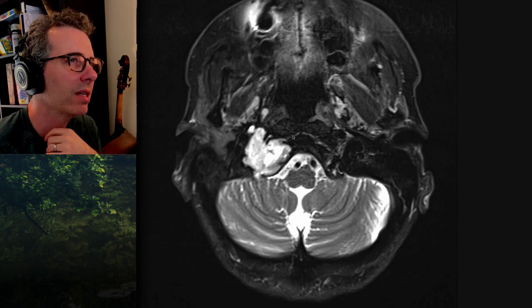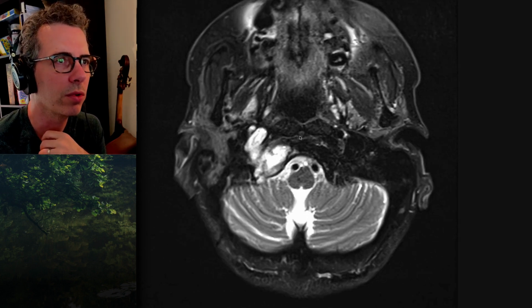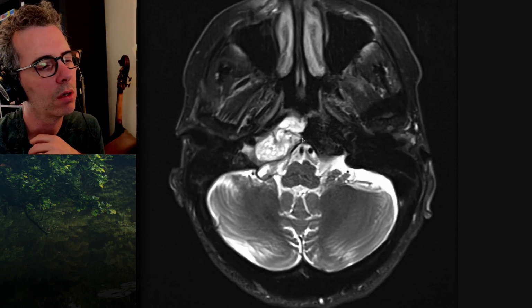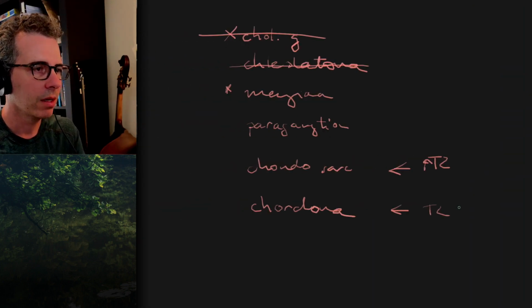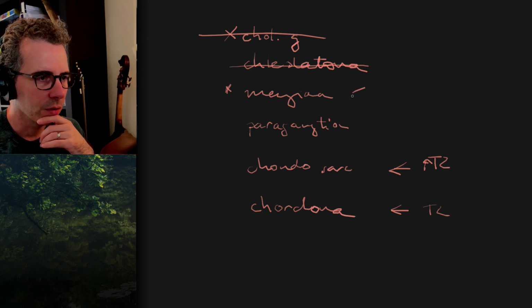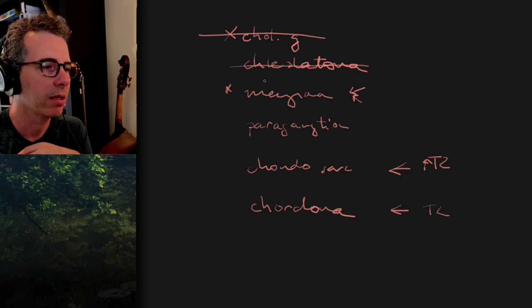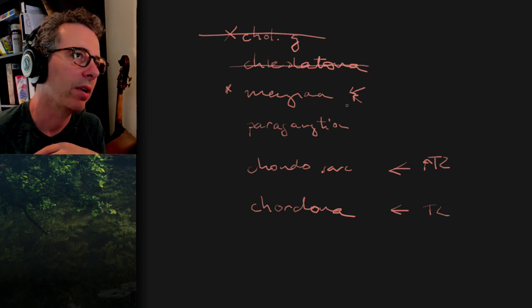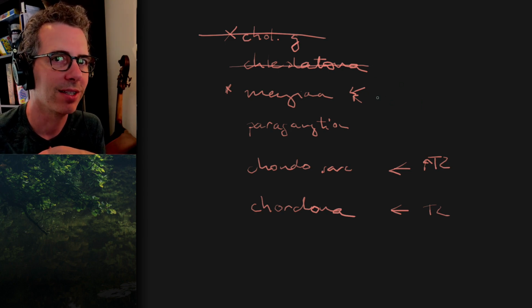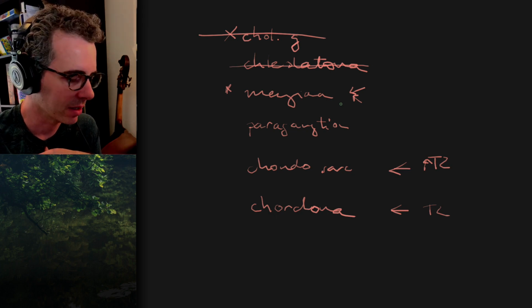But I think when you see such a bright lesion, you really can't not put in chondroid lesions or chordoid lesions. And note that when I say chondroid lesions and chordoid lesions, that includes rare chondroid and chordoid metaplastic meningiomas, but they're rare, and you'll get it wrong. You'll basically never just say, hey, that's what it's going to be. Or if you ever do say that, it means you're getting it wrong most of the time.